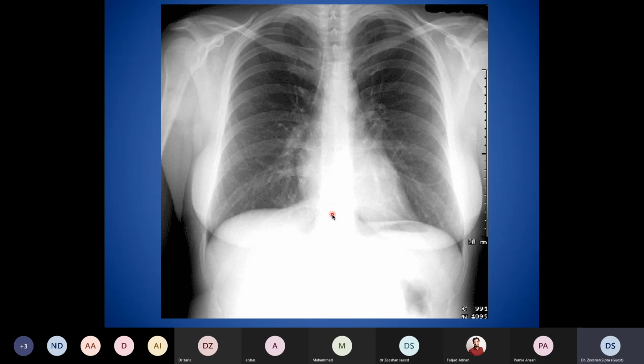If a radiograph was adequately penetrated, the radiographic rays, actually the chest X-rays, were penetrating enough that they passed through the heart, so they make the vertebrae behind the heart shadow also visible.